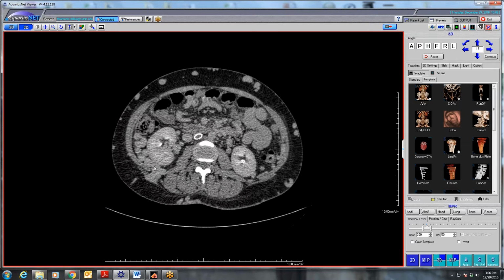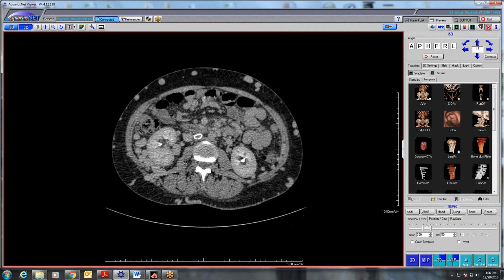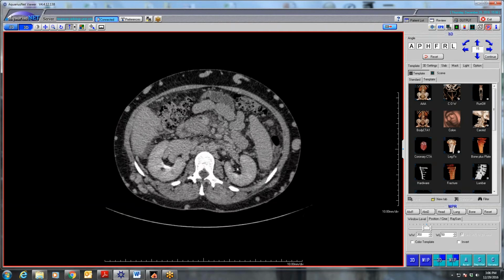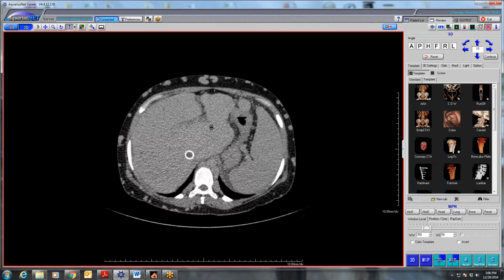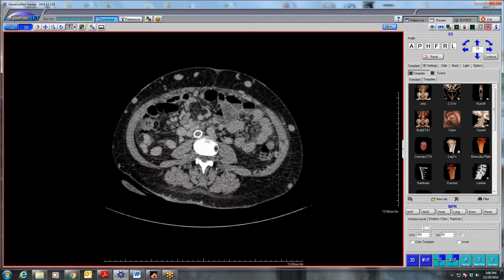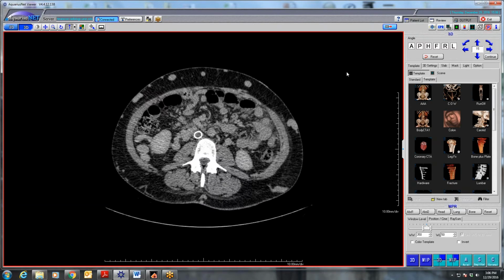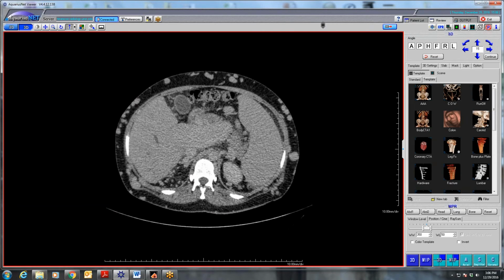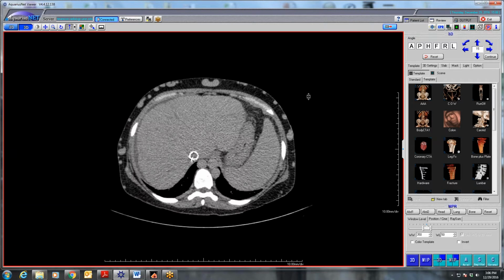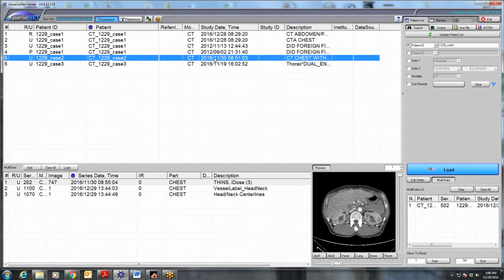These collaterals, you can see them extending from intra-abdominally, going through the musculature, through a small defect into the soft tissues, and now we have this huge spleen and big liver. You always wonder if these are congenital or acquired, but she has a diagnosis of congenital atresia of the intrahepatic IVC, which we've never seen before, but pretty impressive collateralization, to say the least.